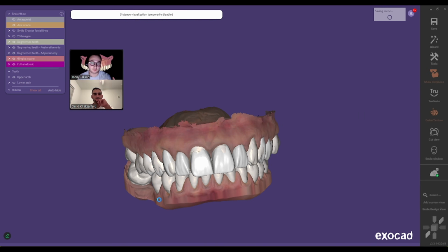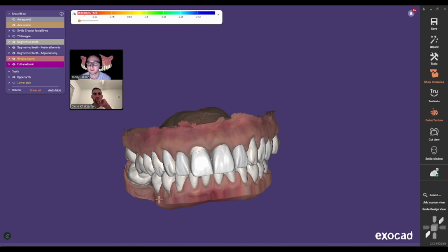Right, and that's our first wax up, and we have teeth in position in the right spot of what is actually kind of possible, right? Yeah. That's the huge part, as far as a technician standpoint, is we have teeth already in a spot that's possible to use for the case. In the next phase, if it goes to preps, we can use this already, and we have all this information. It's this tool right here, and we can open this back up and edit it.